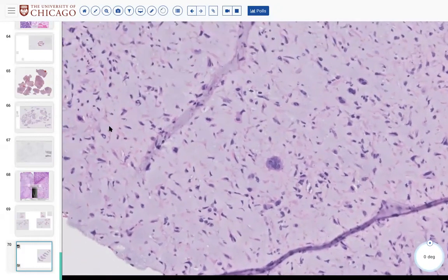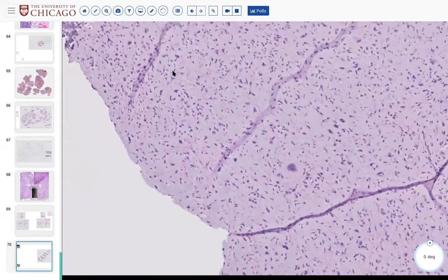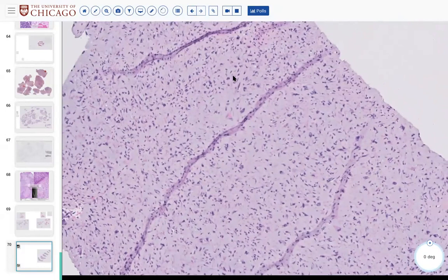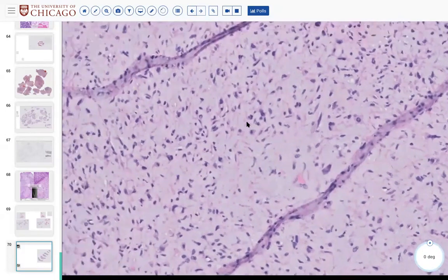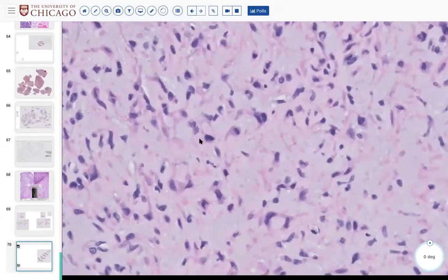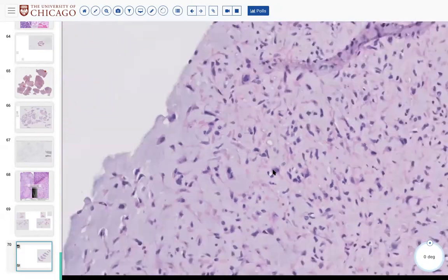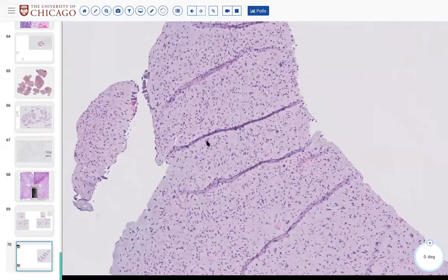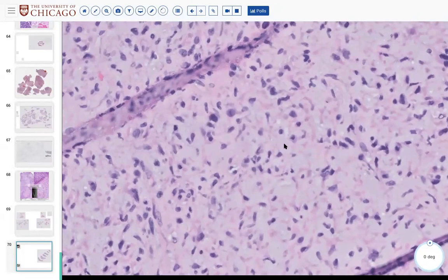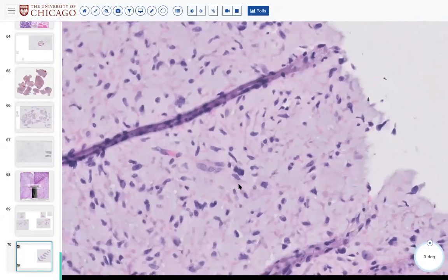One point that was made that is, I think, very good is the absence of really overt mitoses. Yes, you can see a mitosis here and there in these lesions, but they shouldn't be multiple. They shouldn't be atypical. And if you can confirm that clinically and radiographically, this is consistent with a benign appearing lesion of bone, and you see these hyperchromatic, pleomorphic, smudgy looking cells without tons of mitoses, consider that this could be quote unquote pseudo-malignant or pseudo-anaplastic change.